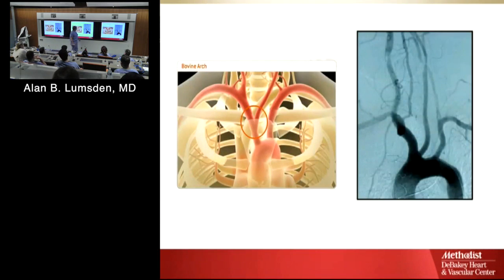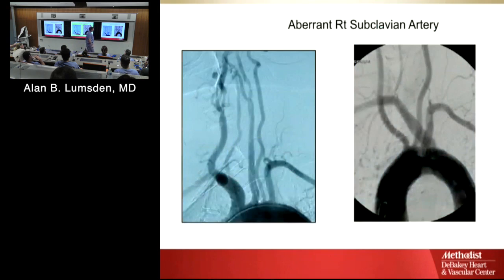Better angiogram. Okay. What's that? That is a vertebral. What's that? Huge thing going up here. Also vertebral. It's pretty large. Okay. What's that? That is the internal mammary. Which one? On the right side. Right internal mammary. All right. Now this is becoming a little challenging. What's that thing, other than the fact that the title's up there?